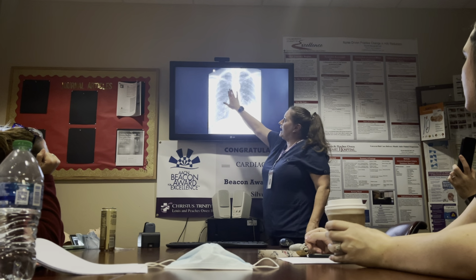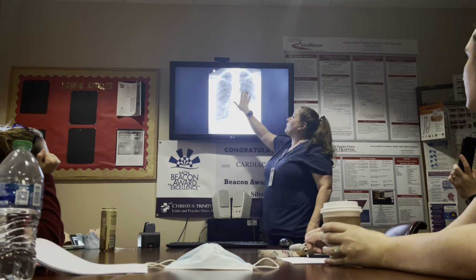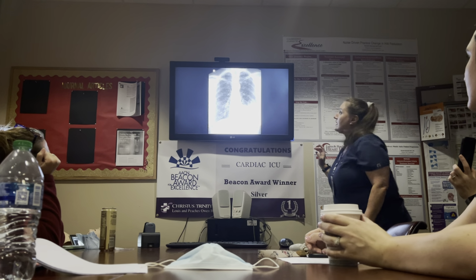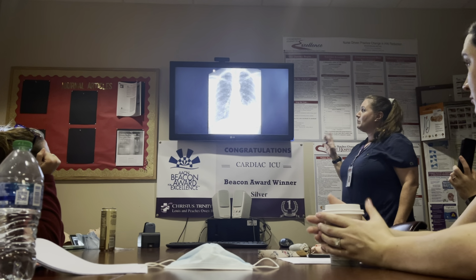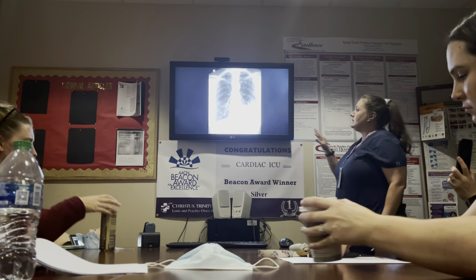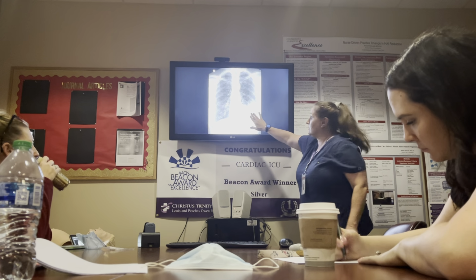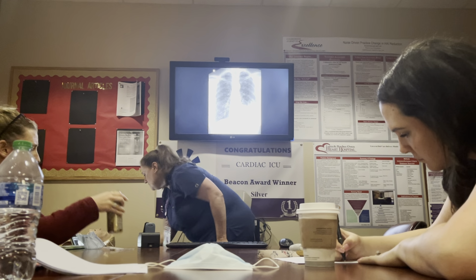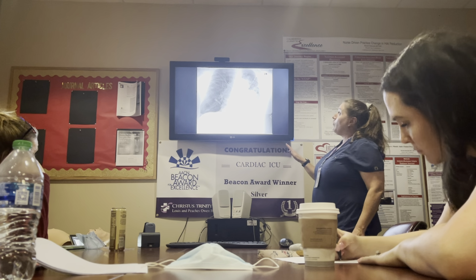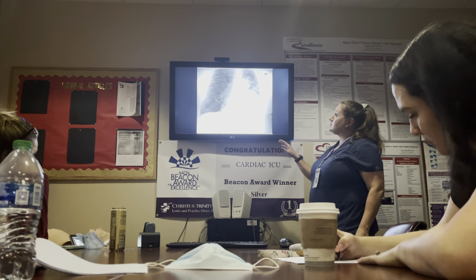Now, the vascular pattern looks a little bit more busy, for lack of better terms, okay? A little bit more fluffy, so there's quite the possibility that they've got some additional fluid going on, but the primary problem is sitting right here, okay? All right. This is a little bit more of a pneumonia picture.